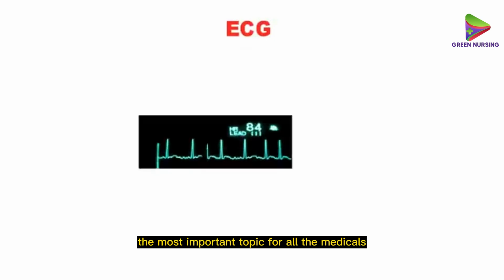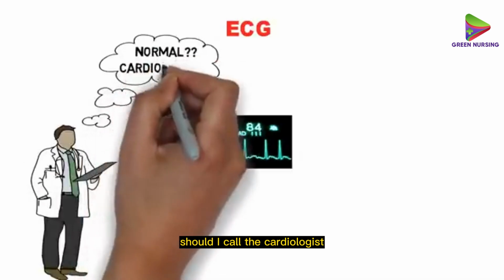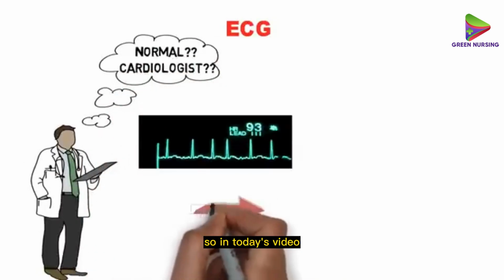We will discuss ECG. This is by far the most important topic for all the medicals. Sometimes you get confused after seeing the ECG. For example like this, and you think, is this normal? Should I call the cardiologist?